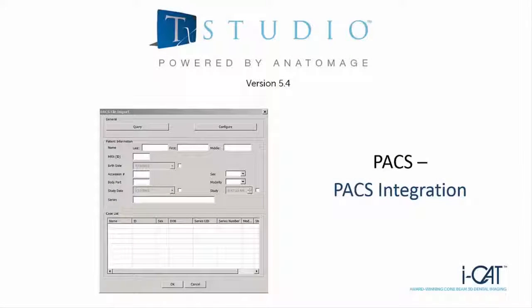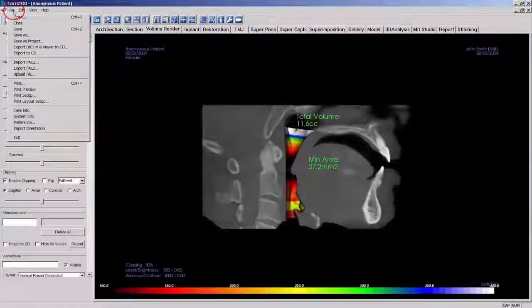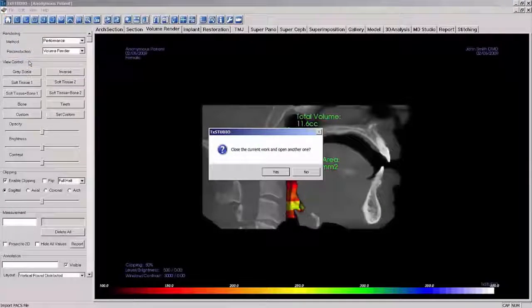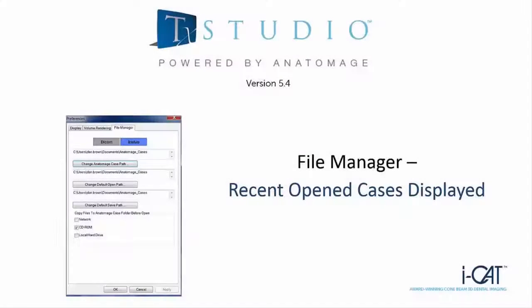PACS integration. TxSTUDIO 5.4 now offers a PACS-compatible user interface. The software directly retrieves patient cases from PACS and opens them. Once the user is finished with case planning, the workup data is re-exported back into PACS. Recent cases are now displayed in TxSTUDIO upon launch.